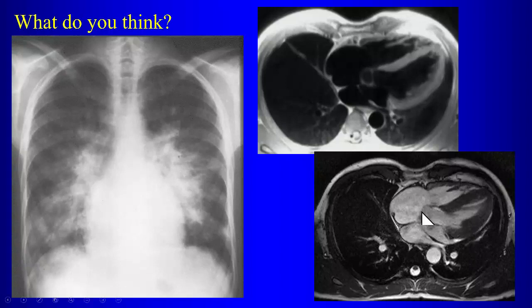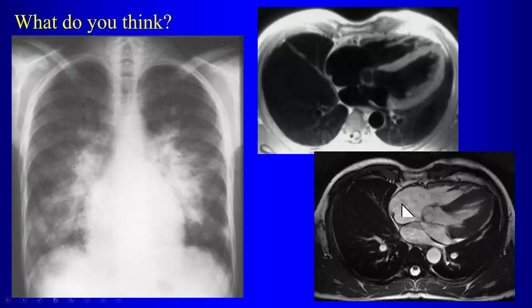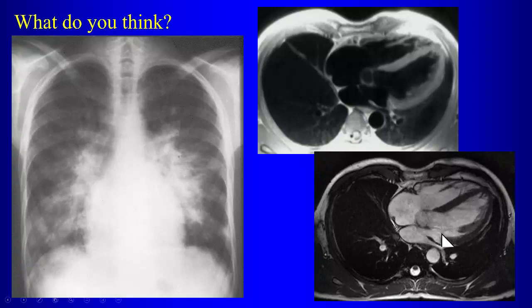So which chamber looks abnormal? The right atrium. Which one? Right atrium. The right atrium looks abnormal? This guy looks abnormal, right? That's true, yeah. What is this thing in here?